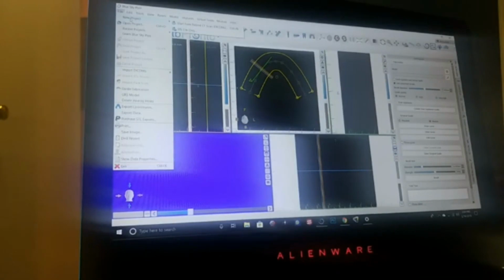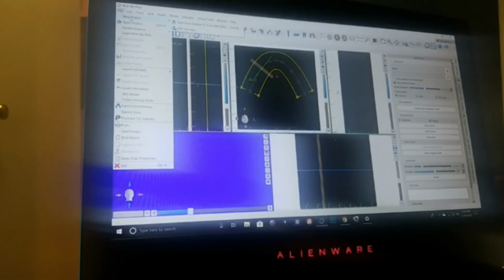So basically, concentrate on understanding the CT and the whole concept of CBCT and why we're doing it, and how to look at a program like this, understand the CBCT, diagnose your patient, and treatment plan your patient. That is what I want you to understand and concentrate on.